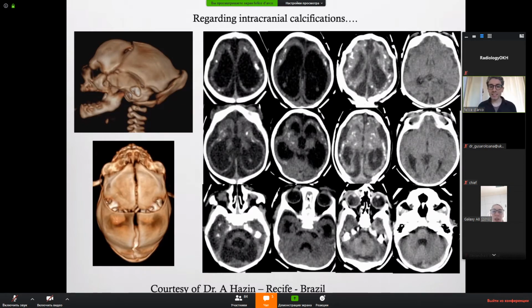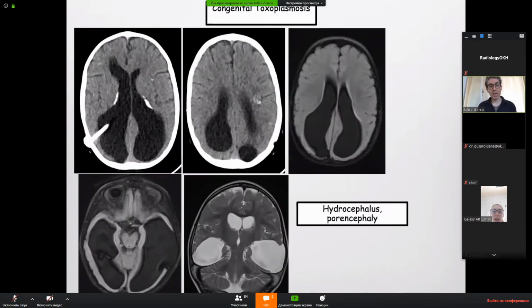But look at this tremendous microcephaly. We don't have the MR, we don't need it, but look at the skull. This is Zika virus congenital infection. Remember again, this is a flavivirus, it's very aggressive, and it hit very early in the pregnancy, creating this terrible microcephaly with a lot of calcifications typical of congenital infection.